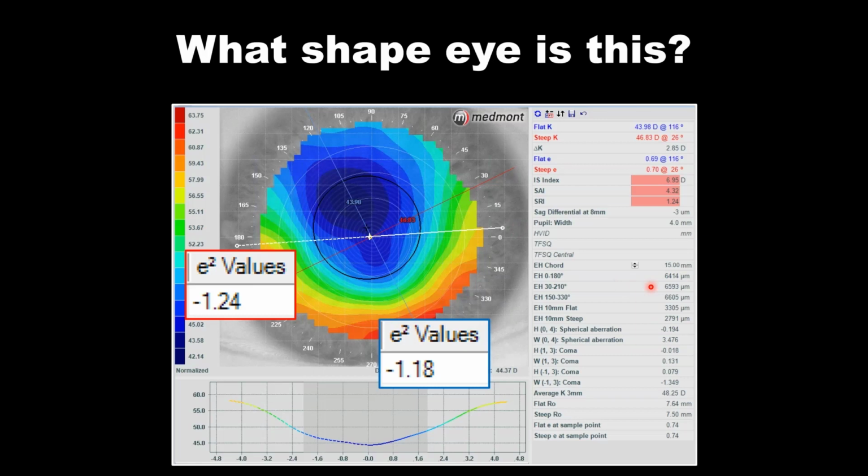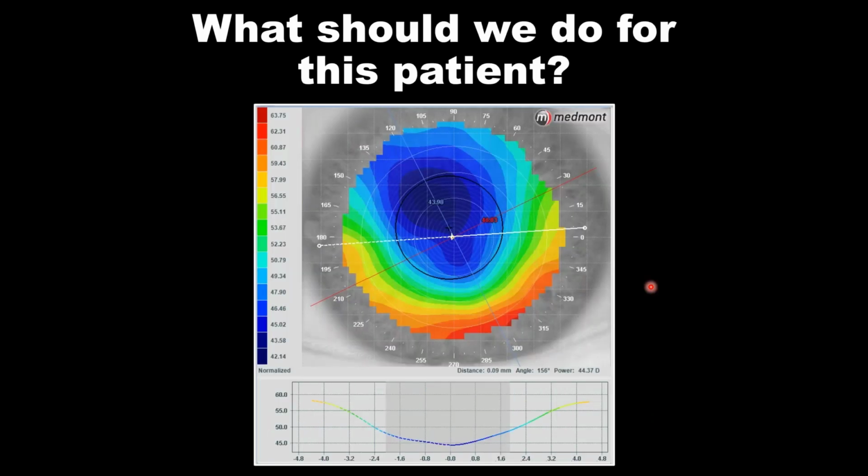So doing a composite would give us much better perspective, but certainly the estimated height attribute is suggesting to you, in your scleral lens set, do not choose the median sagittal depth. Do not choose the low sagittal depth. Go right to the highest depth in your fitting set. So I think for this patient, the options are a little more narrow than they might be for the previous keratoconic patients that we looked at.